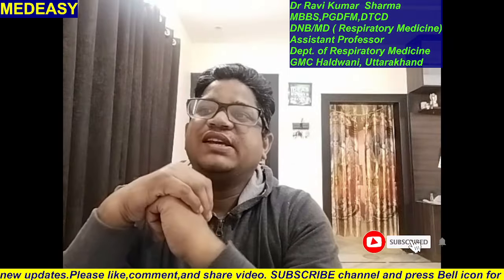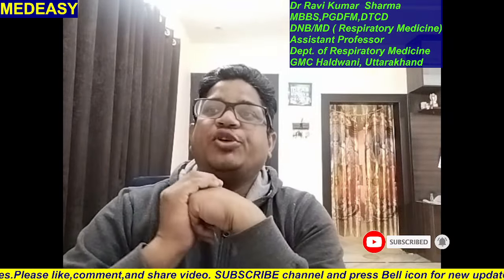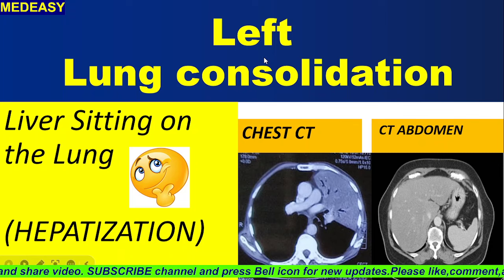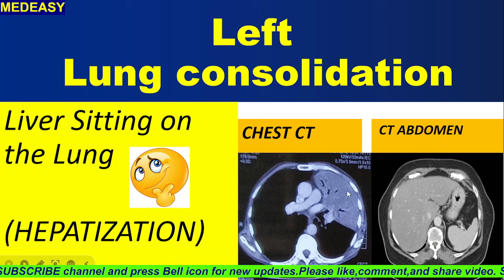So today we will see one of the very beautiful, very classical looking CT pictures of a pneumonic consolidation. How does it look on a CT film? So let's start. This was a case of left lung consolidation where a CT scan was done, and there is a CT abdomen to compare the consistency of the consolidated lung with that of the liver.